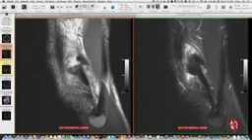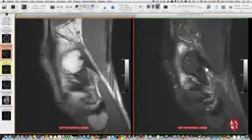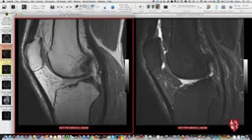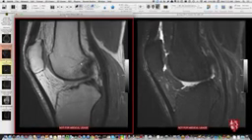That's why, when we look at coronal images for the fibular collateral, you have to scroll from anterior and scroll backwards to track it along. I can show that again in a second. So the sagittal images sweep through, recheck the medial and lateral compartments and the cruciates, and then we're good to go. And we think, well, what have we not seen? Really, the thing we haven't seen is the extensor compartment and the patellofemoral compartment. So you've got the quadriceps tendon, patella, and patellar tendon, looking at the thickness and signal intensity in those on both sequences.